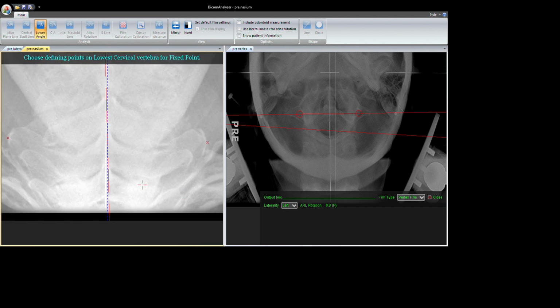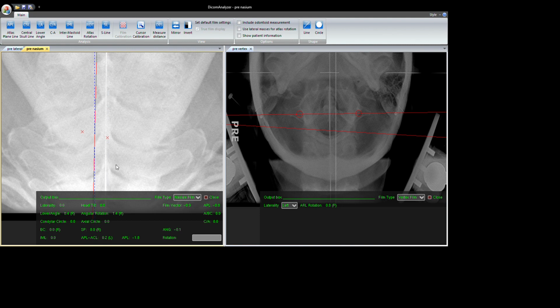And then what you would do is you would click the point where these cross as your center point of the body, and then you would pick the point that is the center point of the spinouses. So if the spinouses were rotated over here, you'd click over there and it would bisect that to give you the center of the foramen. In this case, we don't have to.